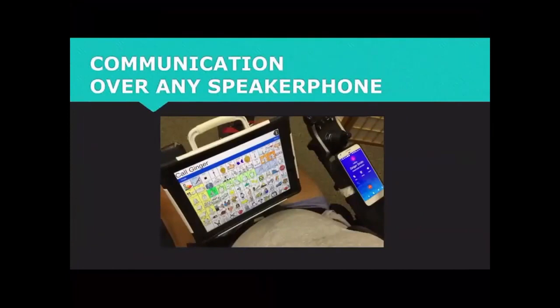What's pictured here is a protective case for the iPad, but it's called a chat wrap. The chat wrap has Bluetooth technology for a speaker, and you can connect the iPad with the chat wrap, and the chat wrap will amplify what's being spoken on the iPad. If you're in a loud room, it's helpful to have a loud speaker there to help with the communication needs of the individual.